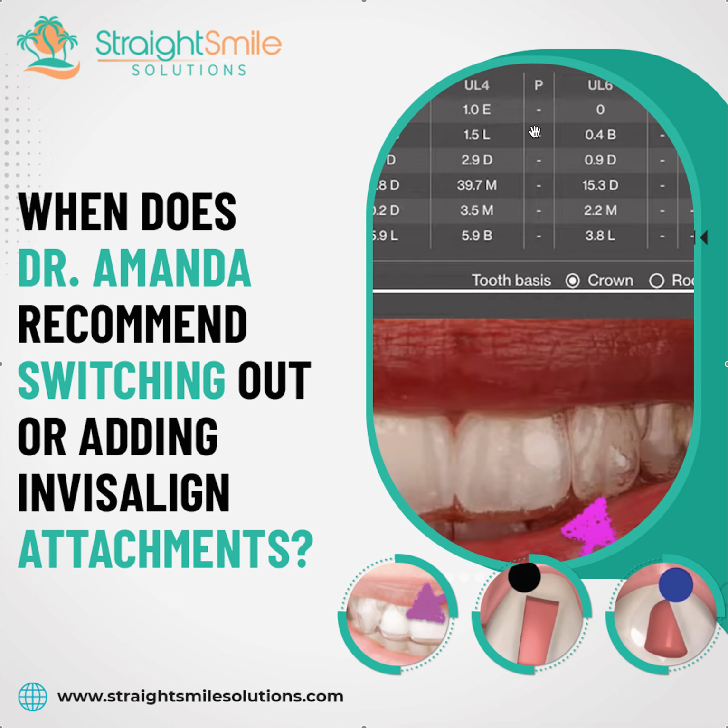I'm going to look at the TMTs, and even though they picked up supposedly the blues and blacks, I'm going to look for subtle blues, ones that maybe didn't get flagged as blues, but are still movement. Especially if I started with a posterior open bite, I'm going to look at all the molars and see if it needs extrusions. If they do, I'm going to make sure I have an attachment on those teeth. I'm going to ask for attachments, especially at refinements. And then, any laterals, your upper laterals, your 7 and 10, your upper 2s, if they are rotated, I'm always going to put an attachment on it. And they don't always default that. So that's something I will always ask for every time, all the time.